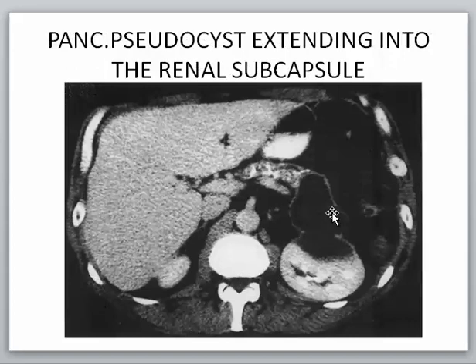This one, the pseudocyst as related to the tail of the pancreas, which is atrophic, calcific, with a dilated pancreatic duct inside. This is the dilated pancreatic duct, and these are the calcifications inside the pancreas, and the pancreas as a whole is atrophic, but it is related to a large cyst, and this cyst is seen connected with the capsule, so it results in indentation of the parenchyma, renal parenchyma, because it becomes a pseudocyst of the subcapsular region.